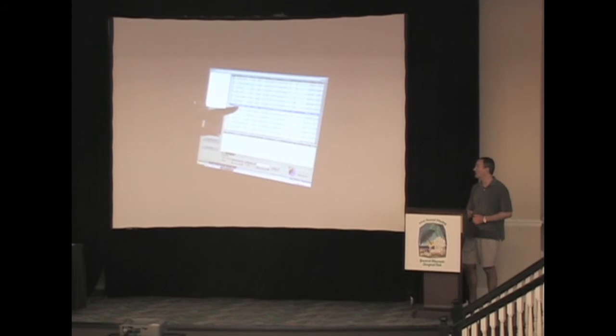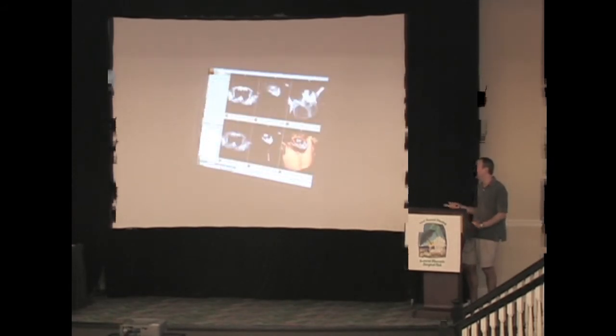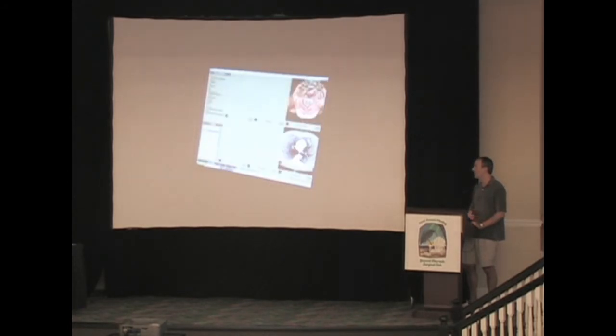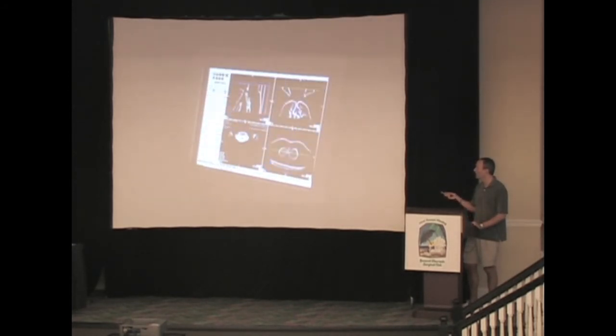The other myth is that these take a long time to do, and this is just a real-time video from our institution using commercially available software, just showing you how easy it is to do this. She just chose an airway algorithm, and you'll see that up in the left-hand corner, she's just doing an automatic trimming function to get rid of anything behind and in front of the airway. In just a second, she's going to pop over to the top right corner, do a little bit more trimming.